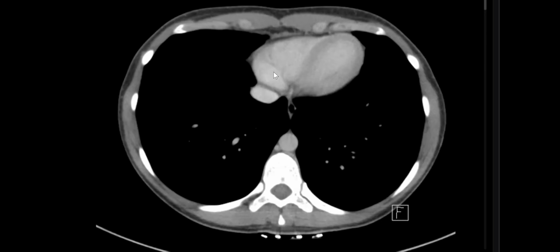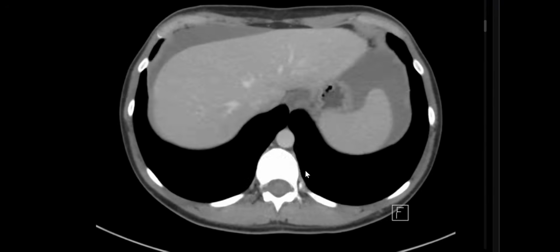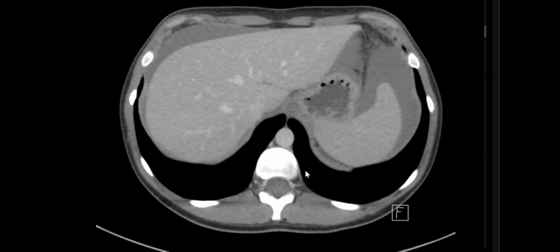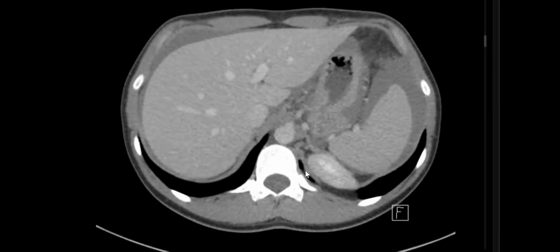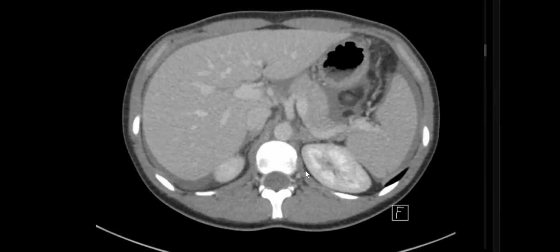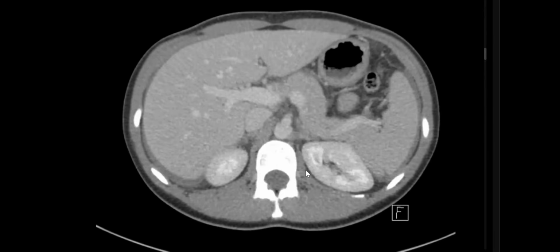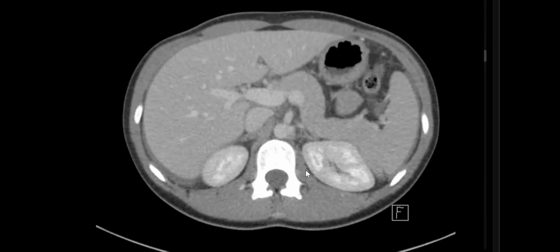Good. Acute pelvic pain, middle-aged female. I'll take a minute to go through the images. I can see there is ascites. The liver looks okay, and the spleen looks okay. I'm presented with axial cuts of a CT of the abdomen with portovenous contrast.